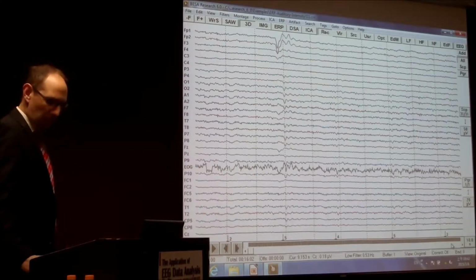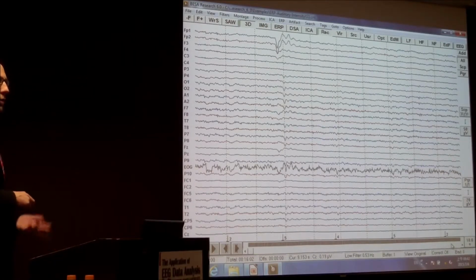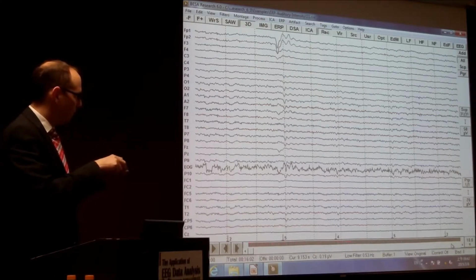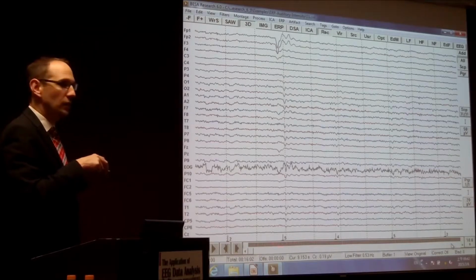Okay, then what we have down here is the bar where you can see the different triggers. Trigger 3, trigger 5, 4, 2. There are other triggers, 1 and 3 as well. And these triggers come from the experiment, how you define them. So here you can see over the file, this represents the 16 minutes of complete file. You can see where the triggers are.